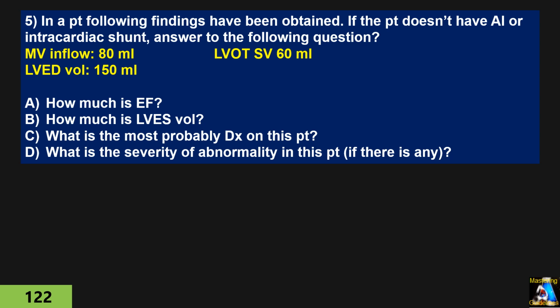A: How much is the EF? B: How much is the left ventricular end-systolic volume? C: What is the most probable diagnosis in this patient, if there is one, based on those findings? And D: What is the severity of the abnormality in this patient, if there is any?